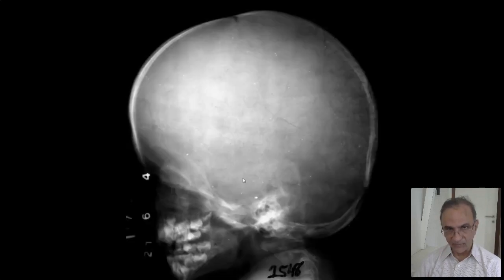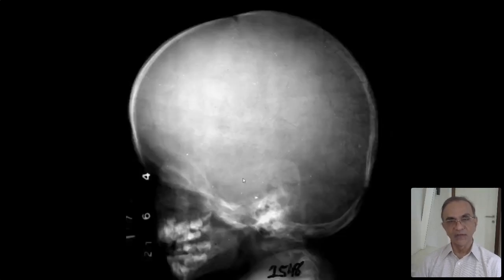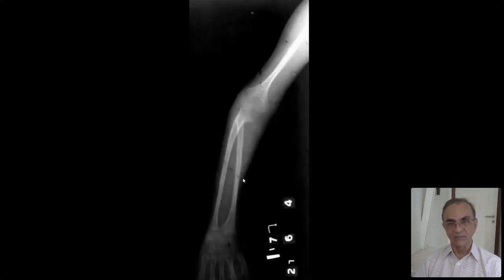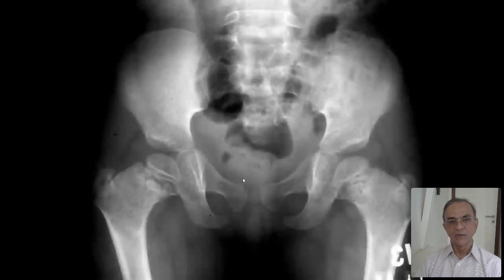Let's go back. Wait a minute. MPS on the left, more of osteogenesis imperfecta. So you have multiple Wormian bones in osteogenesis imperfecta. You can see that also in pycnodysostosis, but the whole skull morphology is completely different one from the other, just in case they ask you in the exam. Okay, this will bypass.